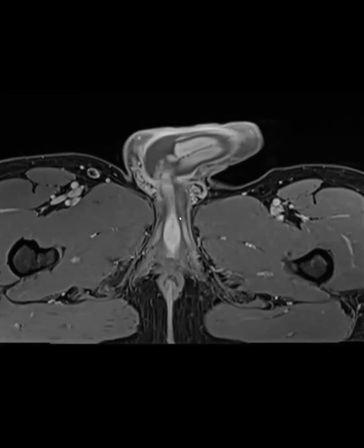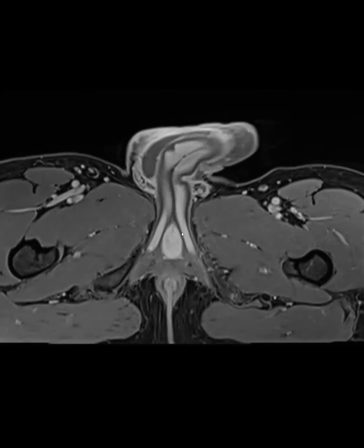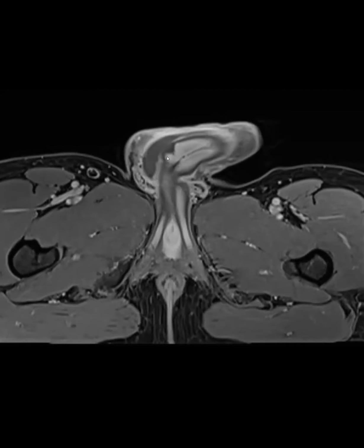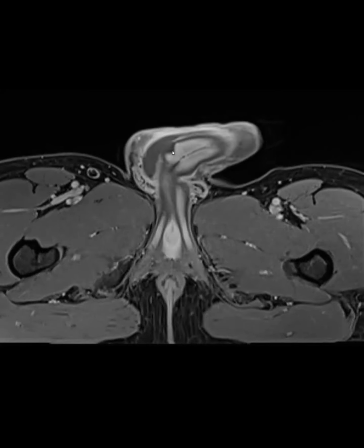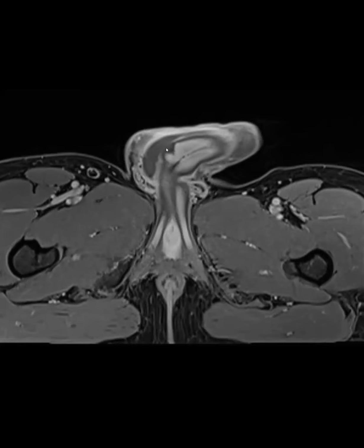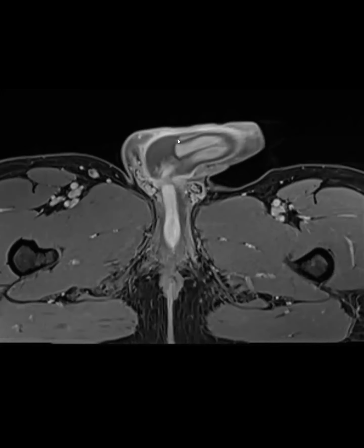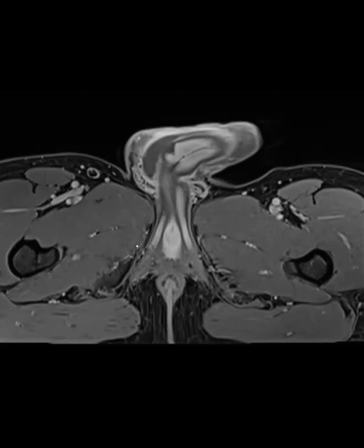Not all penile fractures need an MRI. Some are diagnosed clinically. Many are diagnosed with ultrasound. What you want to do on ultrasound is get a view of the penis where you see the two corpora and the spongiosum, like the two eyes and the nose, and then you look for any disruption in the tunica overlying it, and tell them where it is, what the length is, and how big the hematoma is. They want to usually repair this within 24 hours.